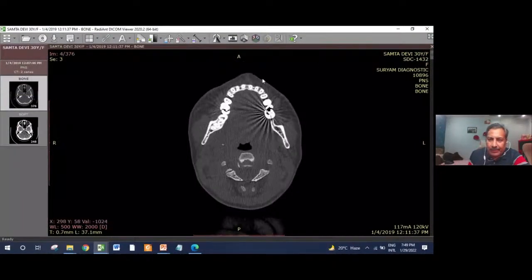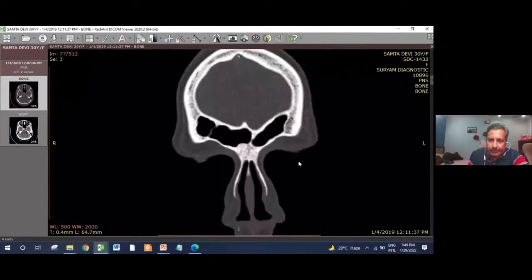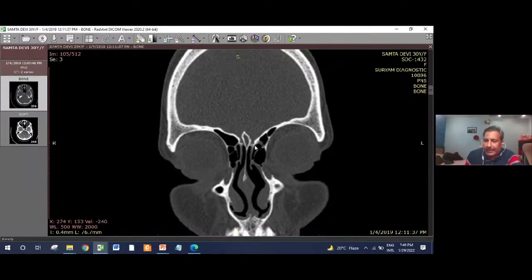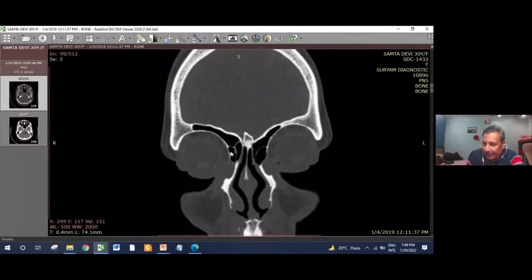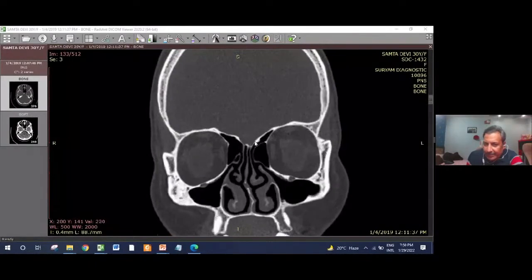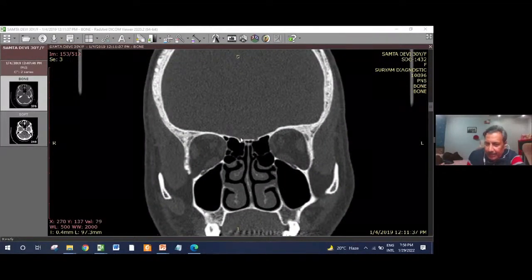The same one, let me bring you for easier understanding. See this. This is the crista galli, cribriform plate. Now, your roof of the anterior ethmoid is demarcated by the cribriform plate here, and the supraorbital cell here. Before going to the cribriform plate, regarding the supraorbital cell, the important information is, as you go behind, as the cribriform plate is missing, the posterior ethmoid starts. See, this is a thick posterior ethmoidal roof.